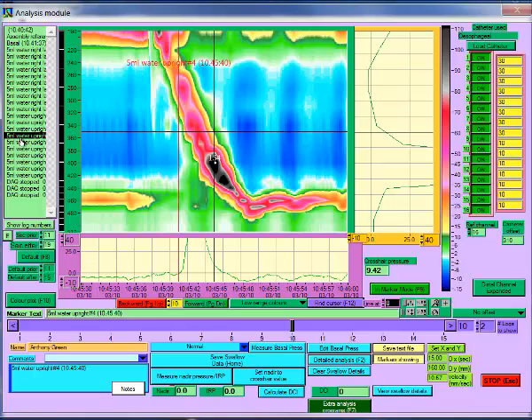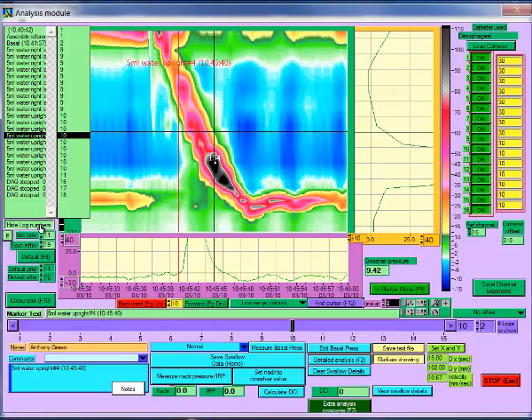In marker mode, the approximate position of the marker is also shown in the purple bar. If you click on Show Log Numbers below the marker text, this will tell you numerically which data log each marker is in.